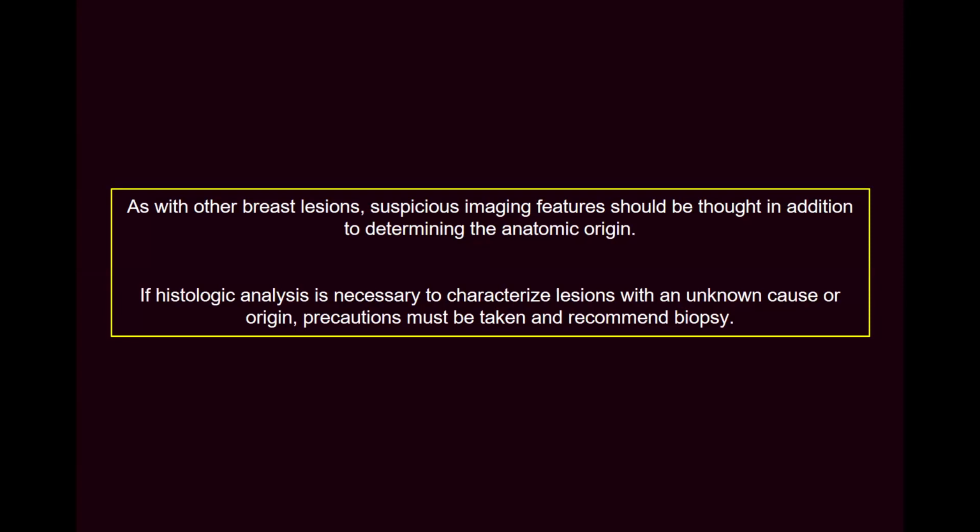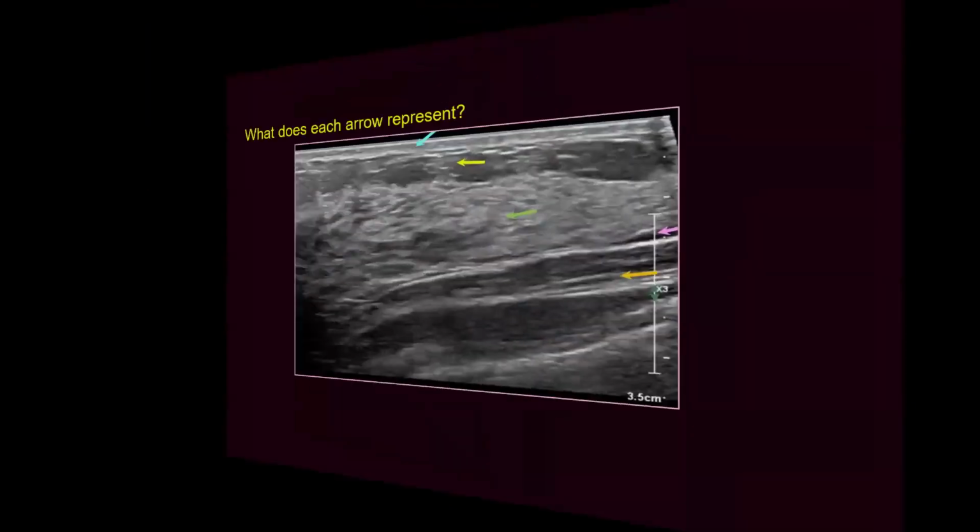No, we have to consider the other features, characterize and categorize it according to the BI-RADS lexicon, and we might recommend biopsy according to these features.